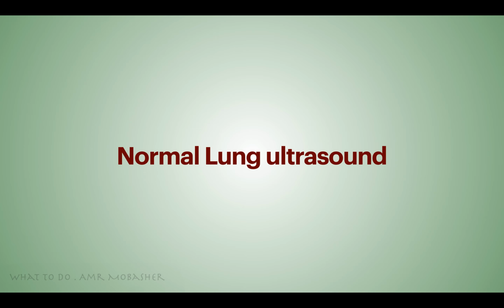Okay, now we'll move to the normal lung ultrasound. We'll answer many questions about that. Which probe should I use? Where should I put the probe? What is the orientation of the probe on the screen? What are the normal findings I can get during the normal lung ultrasound? Let's go through these questions.